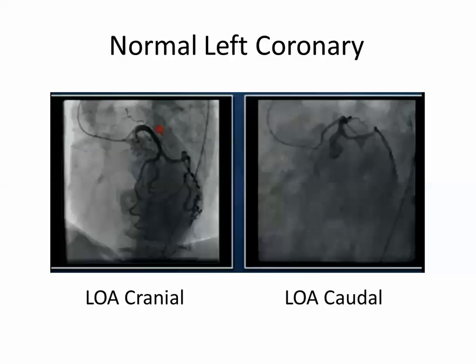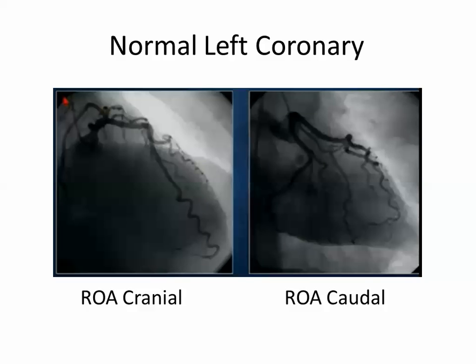Okay, let's continue. We said it before, this was this view. Dr. Alamis, what's this view? The ribs are directed this way, and this is the shaft. So what's this view? As in an X-ray, if this is the shaft of the spine and this is the liver, the liver will be on the right. So it is the right anterior oblique, RAO.